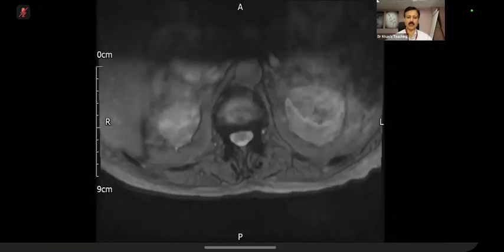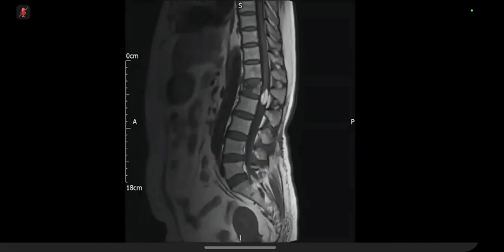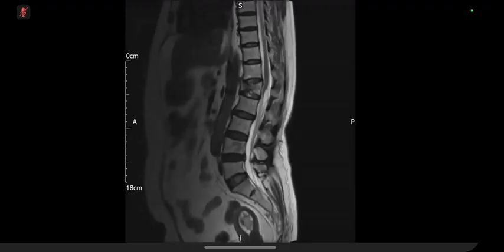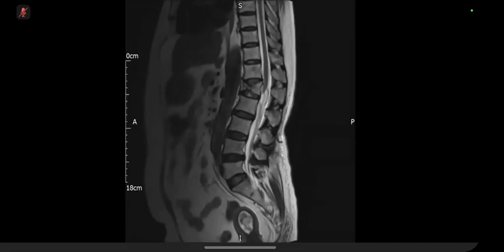Okay. So, what is your conclusion now? So, there's high T1 signal within the cord, so the differentials for this would include hemorrhage. However, I'm trying to find the diagnosis which will put everything together. There are 3 different diagnoses. Okay, so I think one diagnosis would be endometrial cancer. So, very good. What will you advise for that?